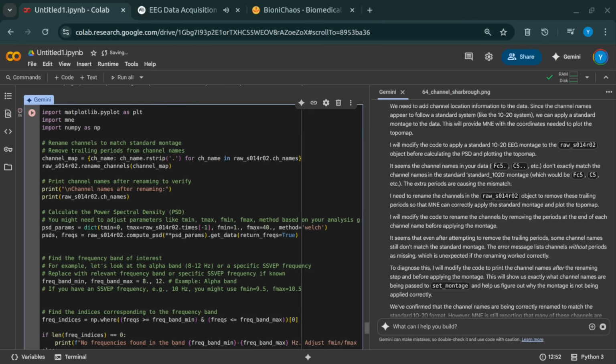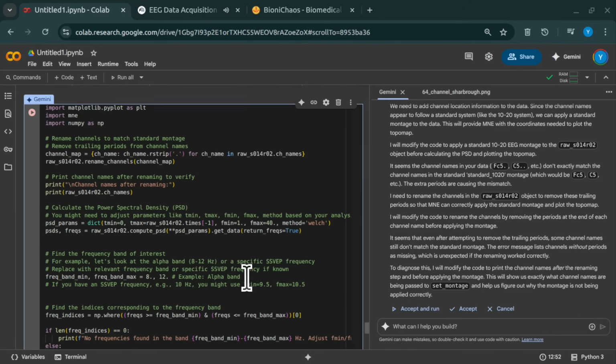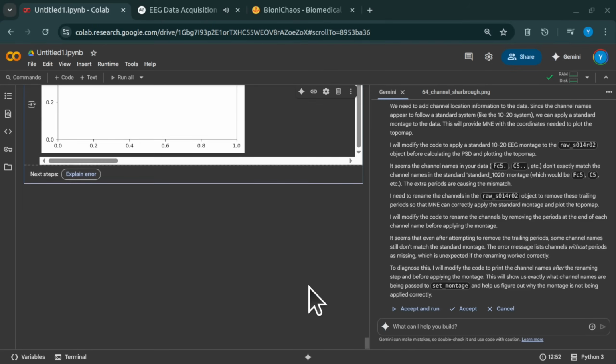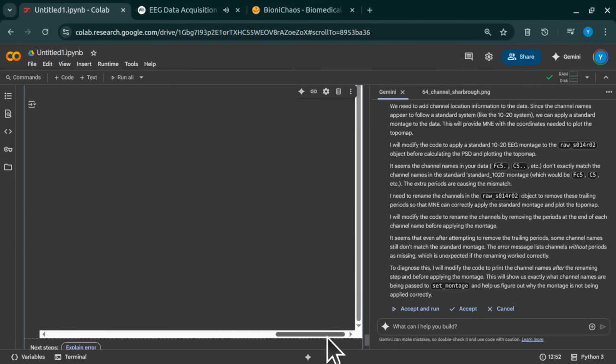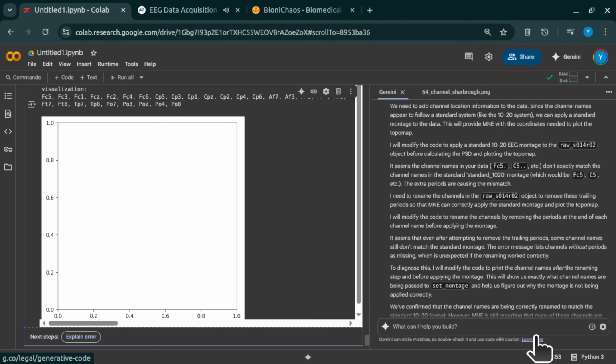Got it. So two different kinds of problems. File corruption versus unknown file format. And the checksum only helps with the first one. Correct. Parsing the .event file requires understanding its internal structure, its specific language. So what started as getting EEG data led us through this landscape of companion files, images, PDFs, checksums, and right into this critical challenge with the .event files.